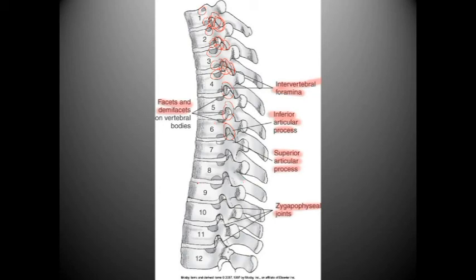Also, we have vertebral body, pedicle, transverse process, spinous process, and I do believe that is it. Also, we do have the intervertebral disc, as we can see, and it'll be demonstrated on CT as well.